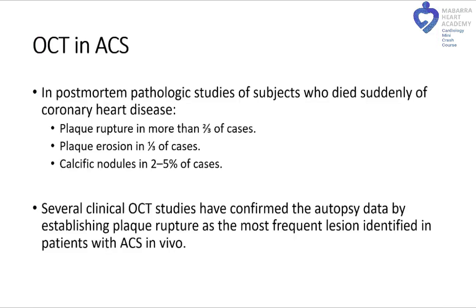So what is the etiology of ACS most commonly seen in OCT? In most cases, the vast majority or more than 2/3 of cases, you will see plaque rupture. In 1/3 of cases, you will have plaque erosion. And in a minority of cases, you will have calcific nodules.